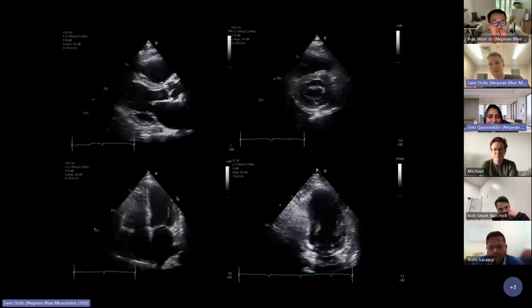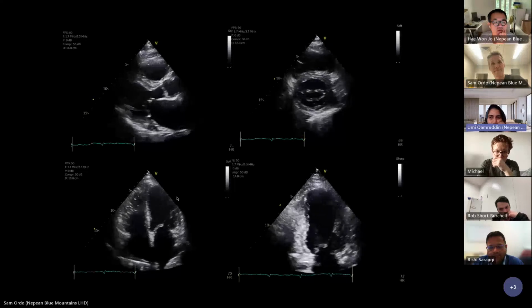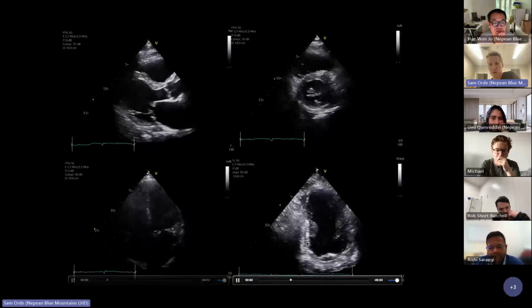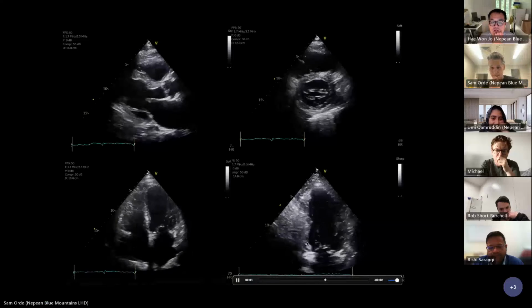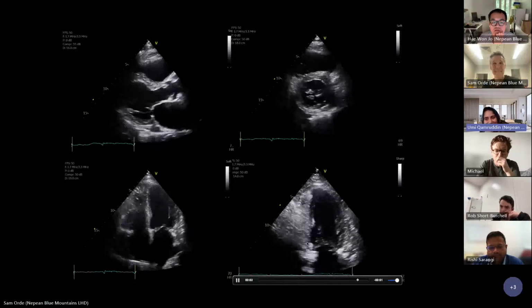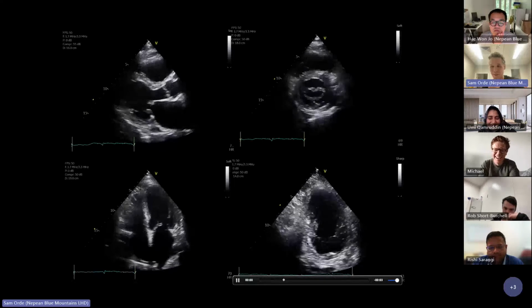If I gave you... you need more. I think you need more images. Yeah, what makes you think that you could do an ejection fraction on someone? I can't. I think it's just lack of my skill. It's the same with me, I'll be honest. It's not every time that you can do these.